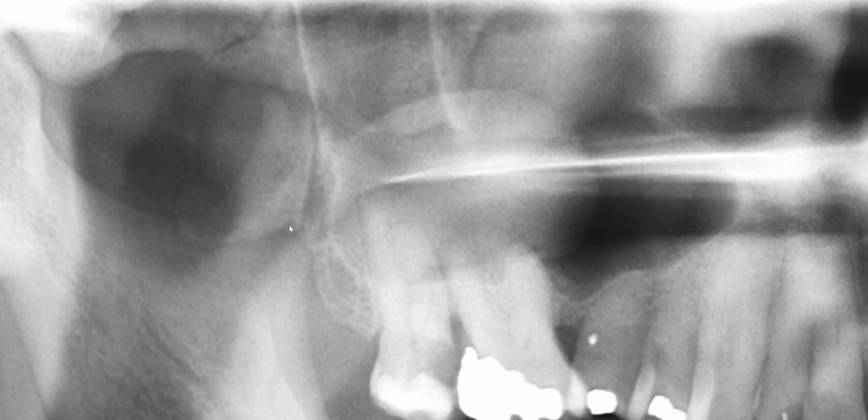Again, we come back to the patient's right side, and you can see that radiolucent line actually doesn't just end here, but it continues superiorly in such direction. Let's see if I can adjust it a little bit better. Yeah, do you see that? It's continuous. It's very straight and has a very smooth outline to it. So what are these structures that we're seeing bilaterally?